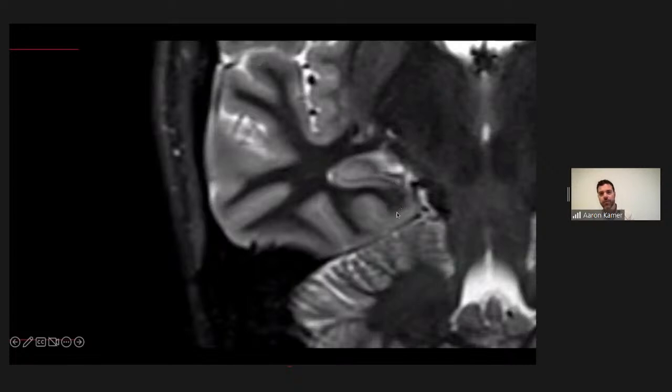So this is parahippocampal gyrus right here. And just as a detailed look at the anatomy of the hippocampus, we can see layers of gray and white matter that fold around upward and inward and kind of curl in like this. This is a very typical, classic, and normal appearance of a hippocampus, where we're seeing those layers. We're seeing the volume of the hippocampus basically fill the temporal horn. You can see the bright CSF of the temporal horn immediately adjacent to the hippocampus. And the reason that I'm showing you this is that when a radiologist is assessing a patient for chronic seizures, one of the main things they need to focus on is the hippocampus.